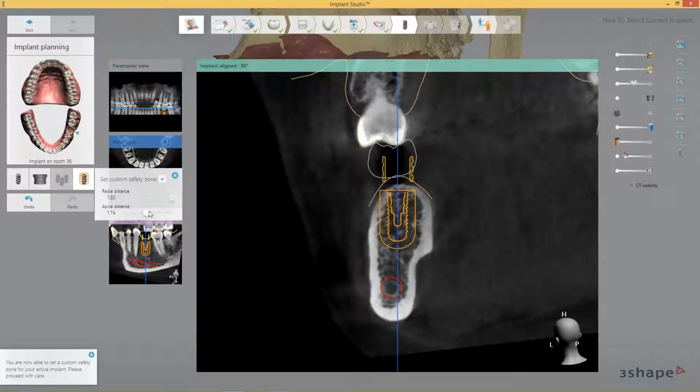The safety zones are of course an old legacy from the analog planning times, when we didn't know if it was exactly or half a millimeter to the side. Today with digital we could actually make them smaller, but as the regulation hasn't caught up yet with the digital, we still have the old regulations.